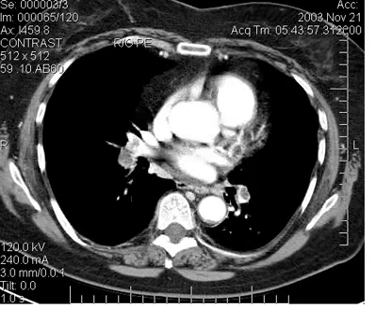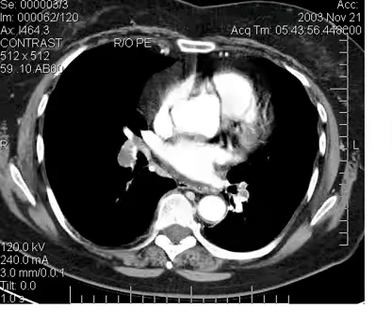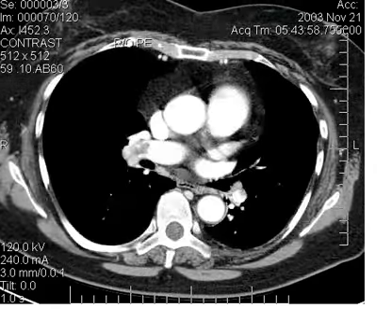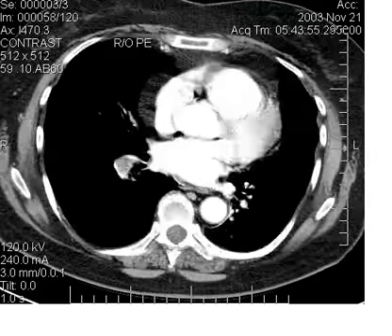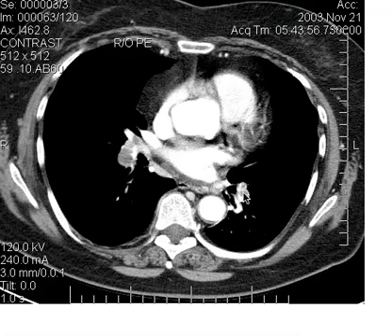And then as we go down farther, now in fact you can see in a left lower lobe pulmonary artery branch, there's a filling defect. Is it real? Sure, we look above it, look below it, go through it, and say, yes, in fact, it looks like it is, as we expect, kind of hung up right here at a pulmonary artery branch point.